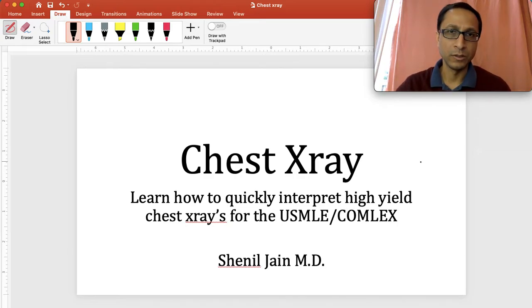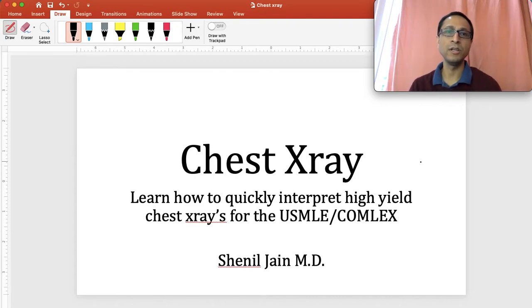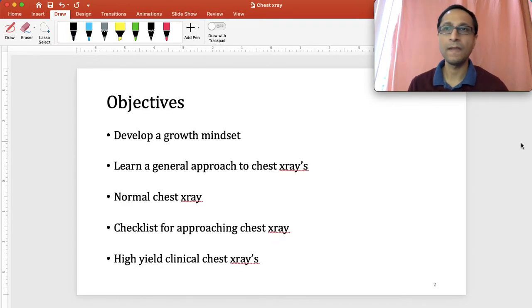In this video, we'll learn about chest x-rays. Again, a lot of students have been asking about chest x-rays, how to interpret them for basic, USMLE and COMLEX. So here we go. Learn how to quickly interpret high-yield chest x-rays for the USMLE and the COMLEX. Again, these are the 5 objectives for the video.